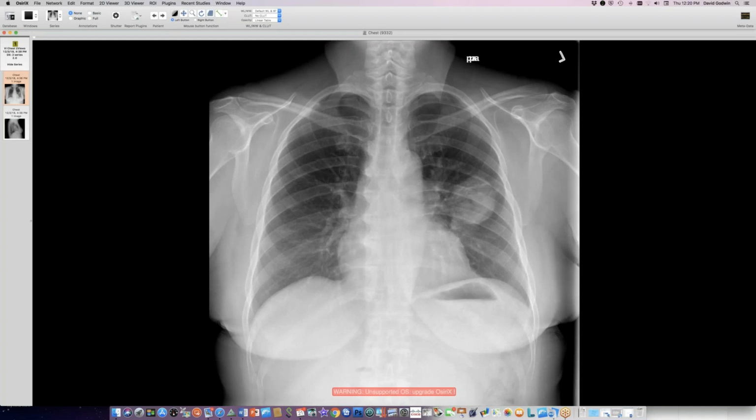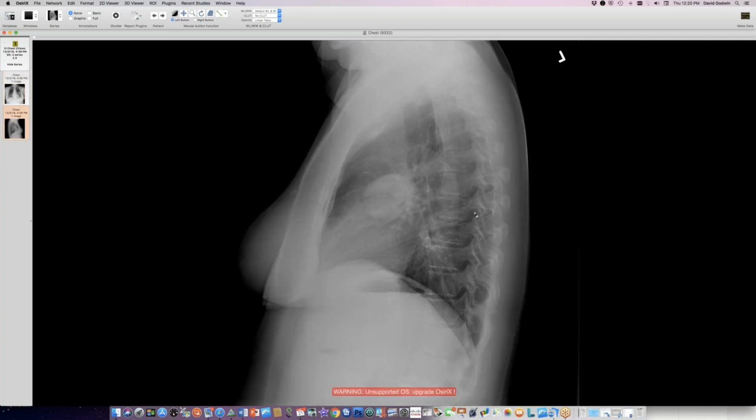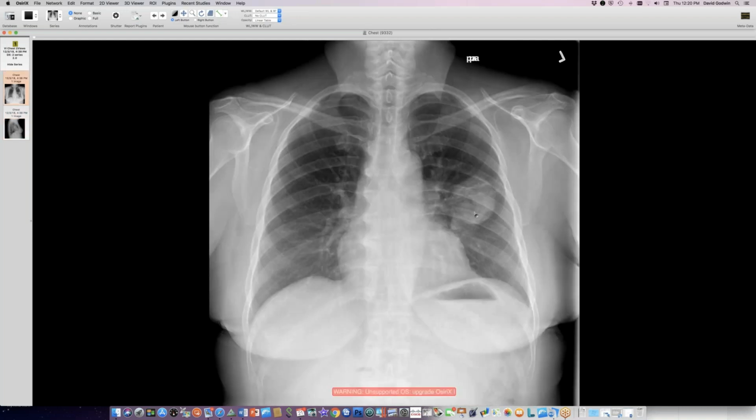Okay, so that was endemic fungus number 1, histo. And here is a woman who has lived in Mexico and in California and in the Yakima Valley, so east of the mountains here in Washington State. She works in agriculture, and we now have coccidioidomycosis in eastern Washington, that dry area. It's kind of like the dry area in California where there is cocci. And this turns out to be coccidioidomycosis. Let me show you what it looks like on CT.